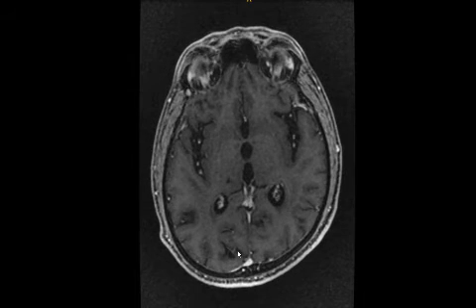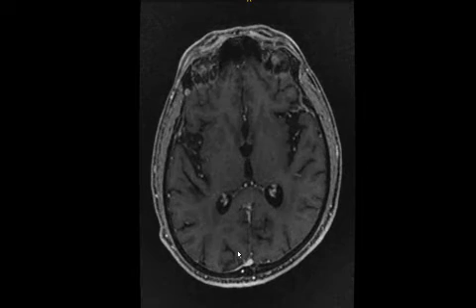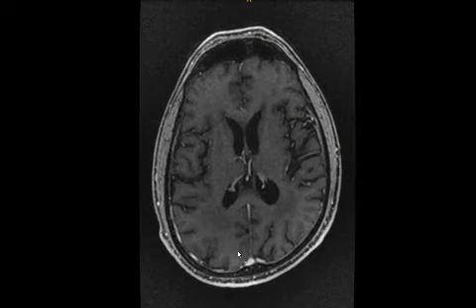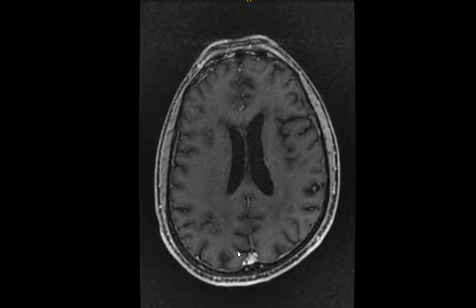So until it's getting loaded, this patient was operated in 2014, and this is already six years into the course. At that time it was diagnosed as most likely a low-grade glioma because the patient is alive more than 5 years now. So good 5 years survival, so to speak.